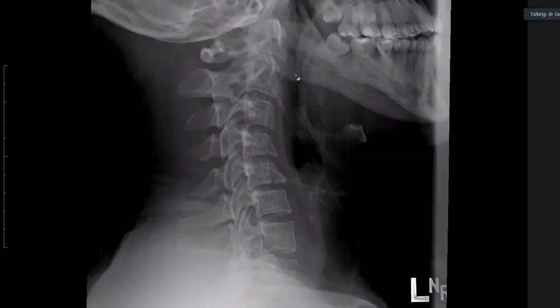Like a head-on injury, like during diving or something? Diving is a possibility. No, it wasn't diving. She fell down the stairs. The first impact was on the head, and considering that, I'm considering injury of C1 or C2. So that's more like axial loading, right? You think that she's been hit on the head, right at the vertex. So axial loading, right?